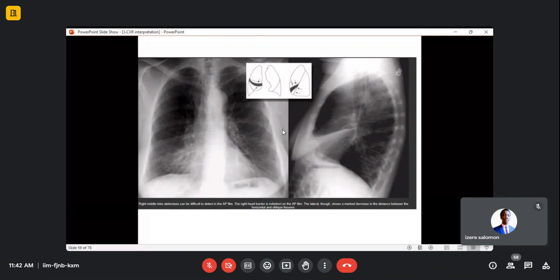But for this case there is cough and chest pain, but no fever. Another possibility is right middle lobe collapse, even if I don't have very convincing signs.